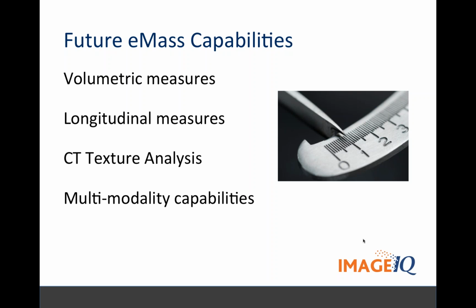Well, because you have these 3D volumes, you can co-register them, and they're going to be slightly different depending on the breath hold, but you can put them together and co-register them to the point where if you drew a region of interest around one time point, it would automatically show up on the next time point. And so you can then adjust that one on that time point. So it makes the workflow much, much faster. You also saw Andrew making those regions of interest and them automatically doing the longest axis.